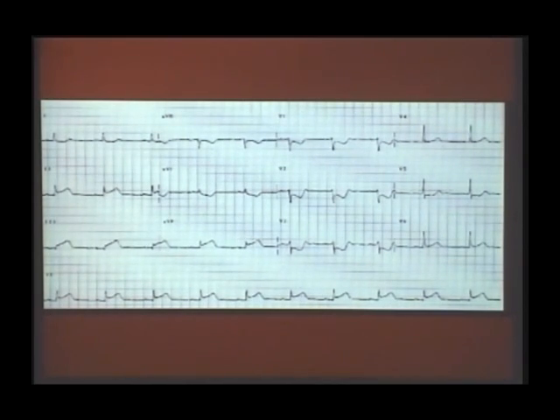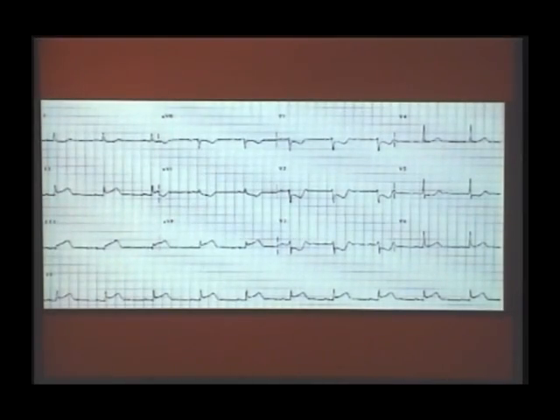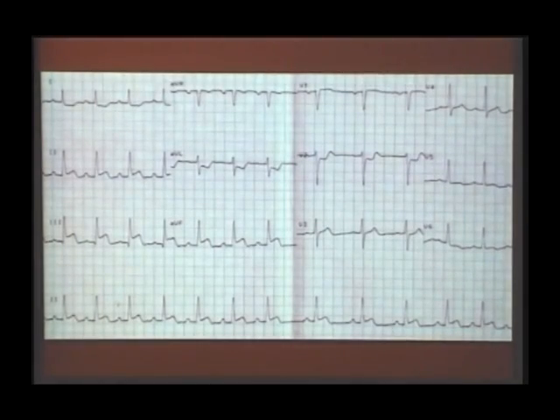So the hyperacute phase at this point is totally injury only. There is no infarction. That's why in all these ECGs, you can see that ST is elevated, but the QRS is normal. Similarly, in this ECG, ST is elevated and the QRS is normal. Still the R wave is very well there. What does it mean? At this point, this myocardium is injured, but not dead.